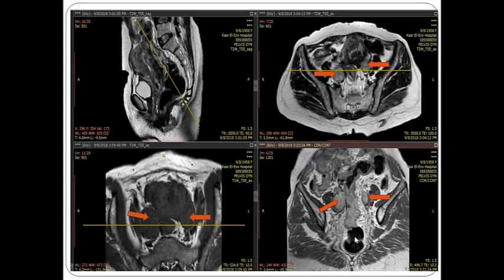So these are bilateral enlarged ovaries that we thought to be benign in nature, and we have the uterus and we referred to the ovaries in explaining this abnormal uterine bleeding, but still we have a more grave lesion here. There is circumferential thickening of the rectosigmoid region. There is a circumferential enhancing lesion involving all of the rectosigmoid.